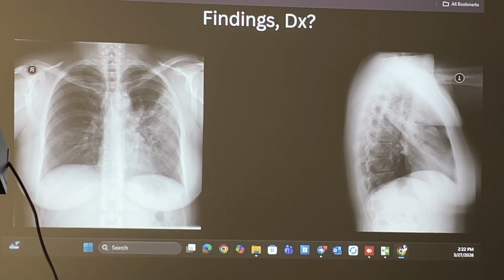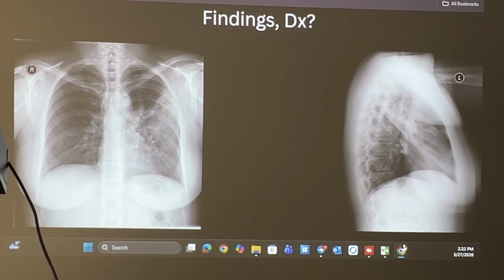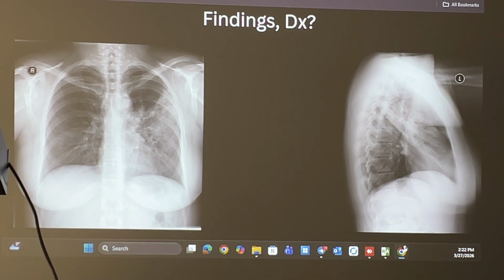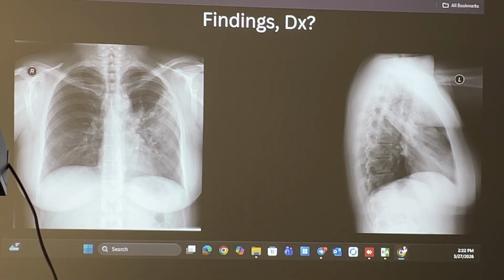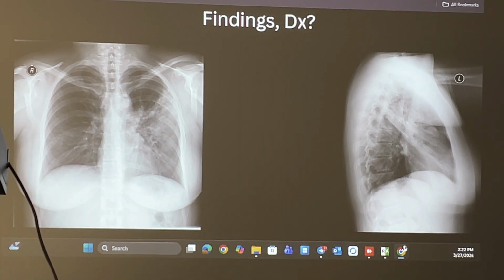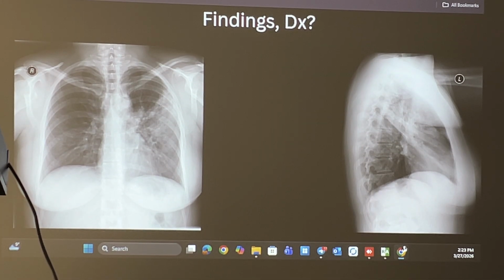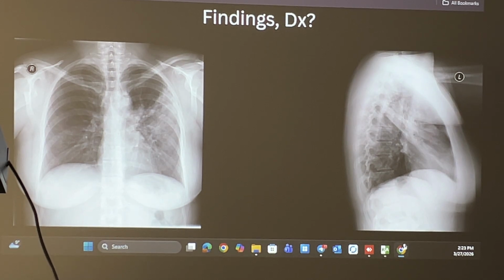Is it the lower part of the lung, or upper, or mid? When you see the lower border of the diaphragm, it is not lower. Middle lobe? But on the left side, do we have a middle lobe? No. That is upper lobe. Here we have upper lobe consolidation.